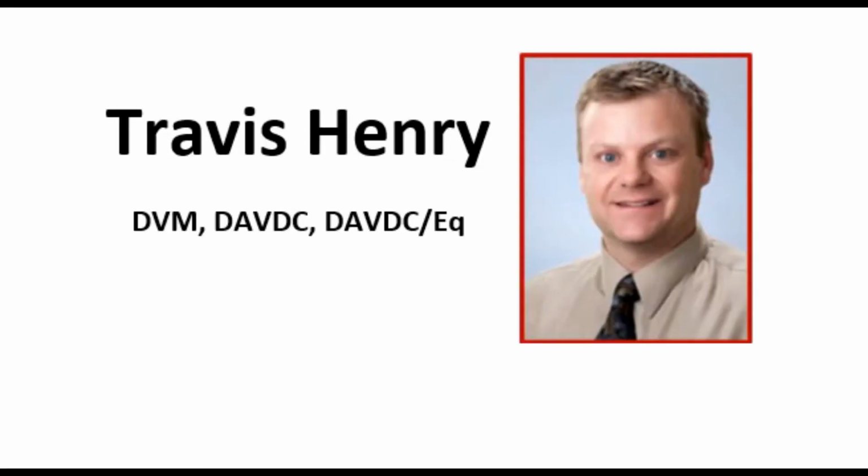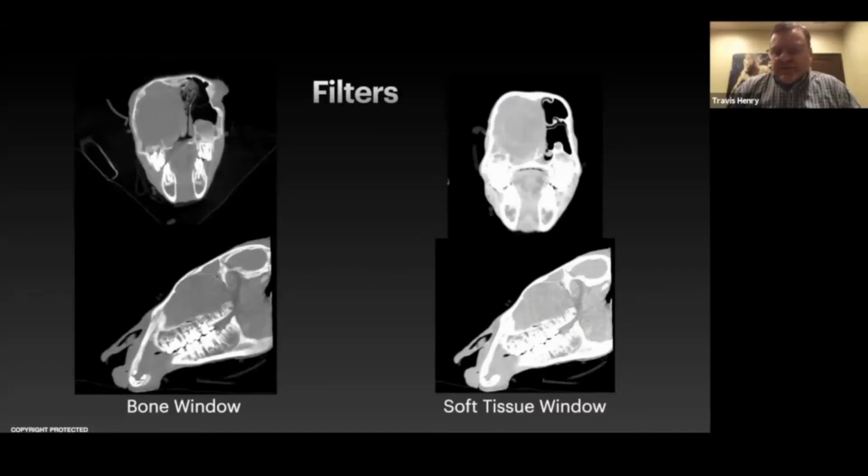When we first look at what CT can do, there's a wealth of information that's gained when we perform a CT study. And the nice thing about where CT has gone is we can actually ask it to give us either a bone window or a soft tissue window. And this is where David could add in at some point if there's questions in this area. But for me as a dentist, and what we're going to look at today, a lot of it is going to be in the bone window, where it really highlights the bone and the high detail of that.